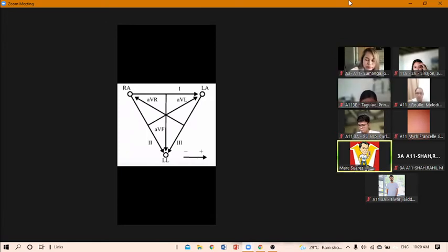So shall we proceed now? We will just do this slowly at our own pace. No need to rush. So I will be marking the bipolar limb leads now.